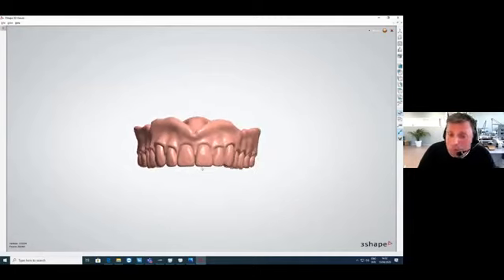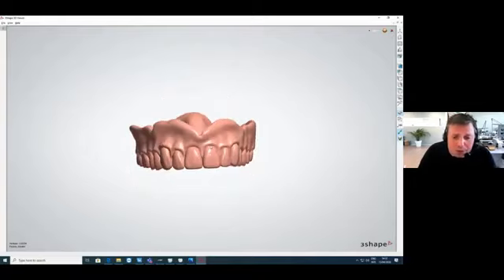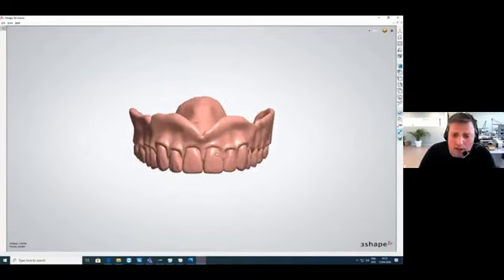The patient can take it home and see the aesthetics. Okay, it's printed in one color, but the patient can get a really good image of how the new denture will look. And it's also really valuable information for you as a clinician, because you can judge all the different options you do normally. So you can judge your occlusion, aesthetics, etc.